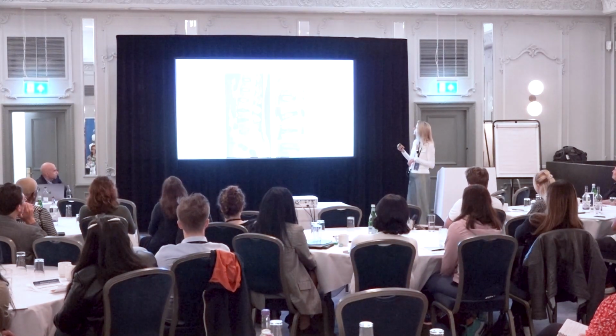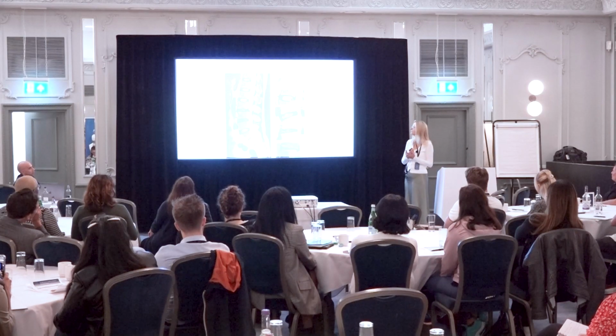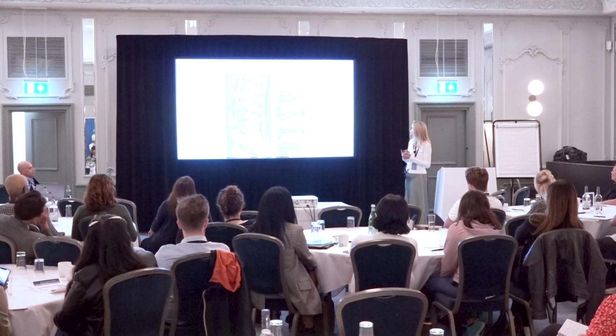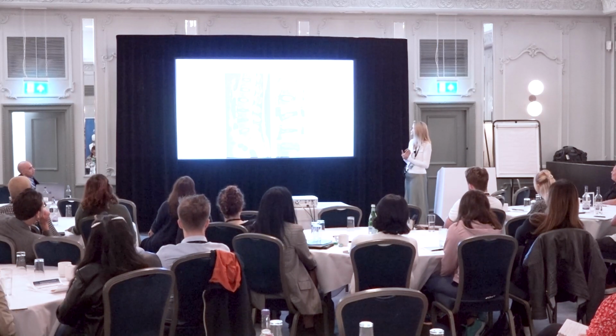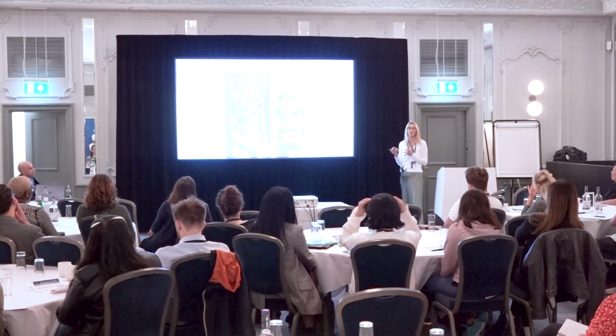Going through the spondylotic diseases, as you saw with the elegant anatomy slide, the imaging shows you various stages of degeneration. I don't bother with grading, I just use the terms mild, moderate, severe. All of us in this room will have some degeneration, particularly if you've been active, particularly if you're older. You'll have degeneration, but it's not necessarily pathological.